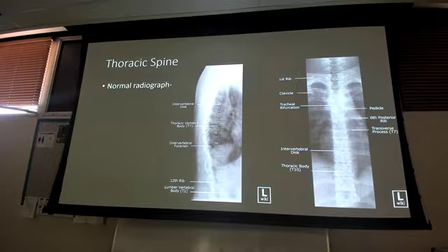But you can still do your lines that we talked about, right? Your anterior vertebral body, posterior vertebral body. Instead of the spinous process line, you can just do your ribs kind of coming down here. Sorry, your spinal laminar. The spinous process still comes down here. You can still do the two lines here on the AP if you want to. So you still do all of those lines to make sure everything's in alignment. You still see your disc spaces, not your discs, but your disc spaces.